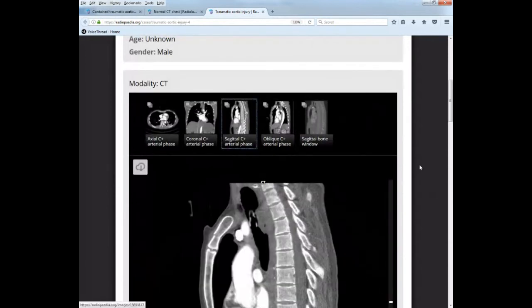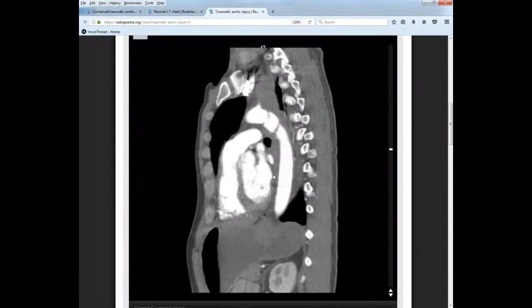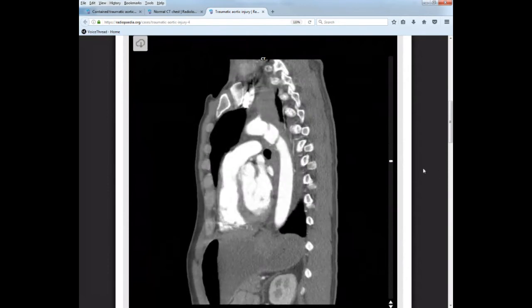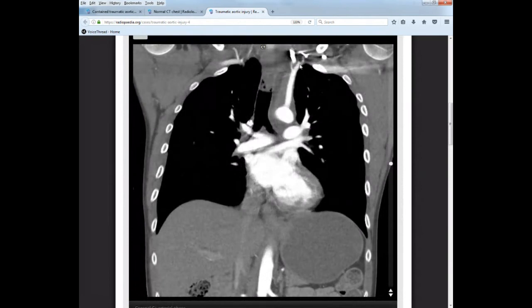All right, last thing we should look at is the mediastinal compartments. So to see the mediastinal compartments, the easiest way to visualize them is in a sagittal reformat. So in the sagittal view, and remember, the mediastinum is just this central portion, okay? It's just this portion right here. It's what is traveling up and down in the very central portion of the thoracic cavity. It's not over here, it's not over here, it's just the central portion.